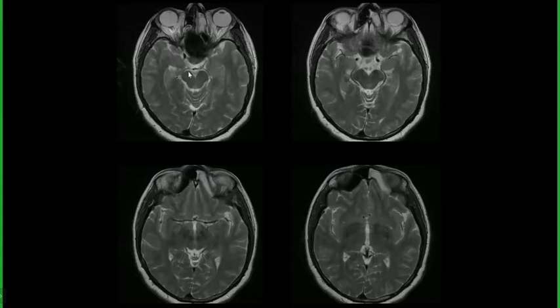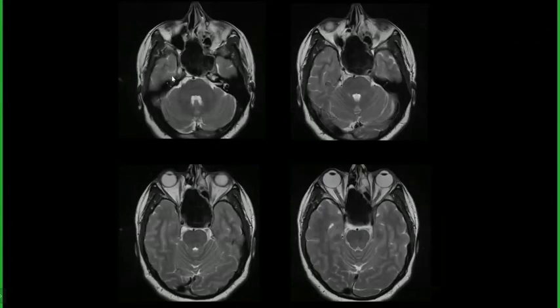Yes, go back to the previous set of images. When you see an image like this, because you have seen the rest of the images, you are saying that there is a mass. Otherwise, what you are seeing is just a widening of the bone there. We are not seeing any mass. It appears basically darker on T2. So there is some sort of widening of the lateral wall of the sphenoid sinus. So when you see a lesion like this, what are the things you will think of?